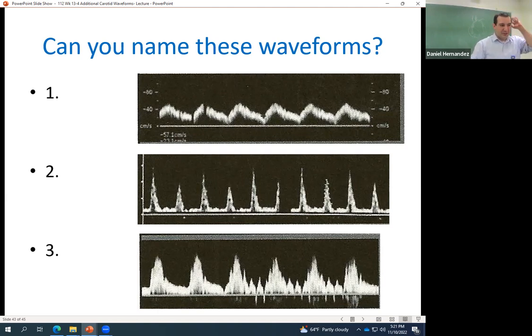There's no blood flow getting up there. The body's going like, oh crap, I need blood. It's calling out for help. Hey, ECA, can you help me out? Those collateral channels opened up between the ophthalmic and the ECA branches. So now the ECA can bring blood flow to the brain because of those connections up here. So now that ECA is acting like the ICA because the ICA is occluded on that side.